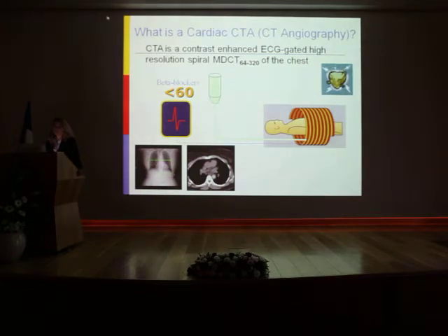So what is cardiac CT angiography? Briefly, it's a CT angiography, however, we have the constant cardiac motion which we should overcome. This was overcome by using cardiac gating, which is registration of the ECG during the acquisition, and for that we need to give the patient beta blockers to lower the heart rate and get a stable heart rate. We inject contrast in large volumes and fast, and we aim at acquisition while the contrast is in the left heart system.